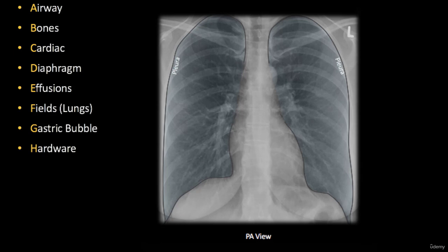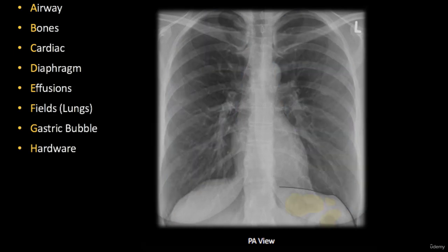We also look at how symmetrical the lungs are, sandwiching the mediastinum in between, in the center. Any deviation here will indicate pathology. Under the left dome of the diaphragm, you can see some oval-shaped shadows. They are the air bubbles which we have inside of our stomach. And the appearance of these bubbles on the X-ray is an absolutely normal sign. They are normal structures.